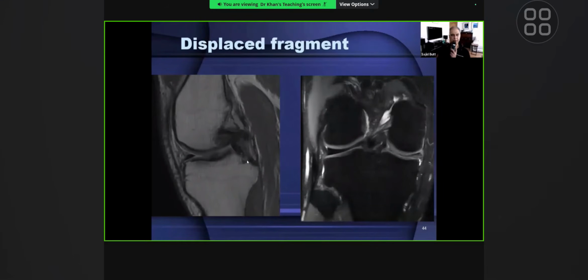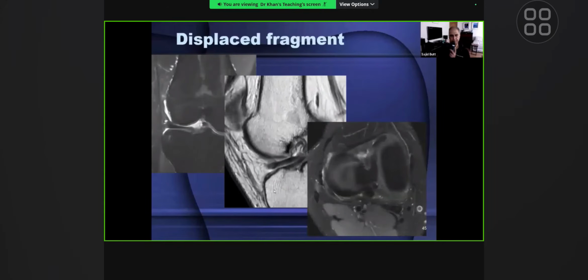It can be good exercise and good fun to try and look for the displaced meniscal fragment, which usually happens in the intercondylar notch. So we've got the right knee joint, lateral side is here, medial side is here. We can see that the body of the medial meniscus is showing increased signal intensity, and it's smaller in size, and there is this displaced meniscal tissue, which is present in the intercondylar notch.